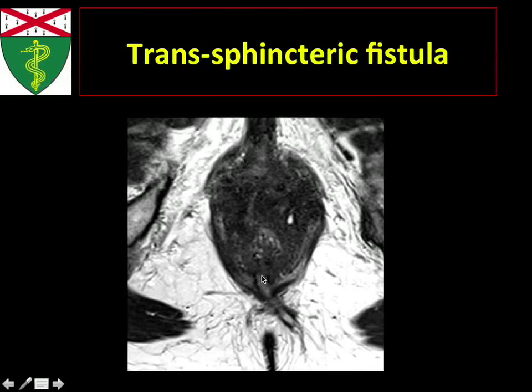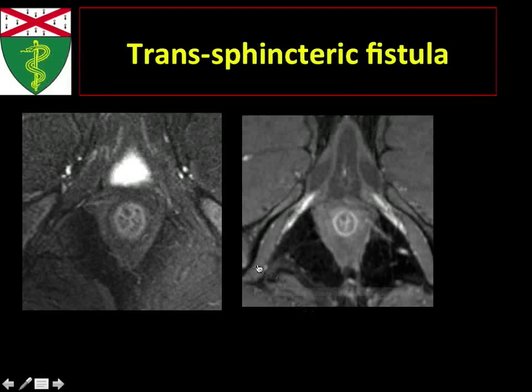And this is the static image showing how it's arising from the 6 o'clock position and going through both the internal and external sphincters out to the ischioanal fat pad. And they can be kind of subtle at times as well.